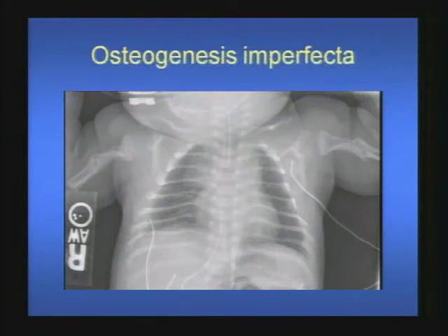I'm showing some examples of corner shots of skeletal lesions detected on chest radiographs. This is our first unknown, a newborn presenting with multiple fractures. You can see that the fractures involve the shafts of bilateral humeri and several ribs as well, and they are already in various stages of healing, which indicates intrauterine timing of the fractures. This was a case of osteogenesis imperfecta, which predisposes to multiple fractures of the axial and appendicular skeleton.